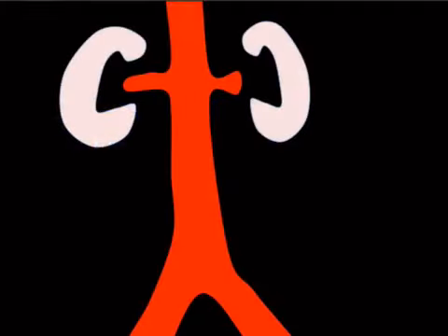So where do you place an IVC filter? The typical position is here, with the tip below the renals. Above the renals has a theoretical risk of renal vein thrombosis, theoretical. Now, your incidence of PE is decreased. That's the point of placing one of these things. But you actually have an increased risk for DVT. And you also have an increased risk for caval thrombosis, which makes sense.